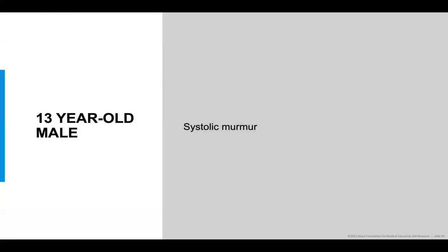Okay, this is a 13-year-old who went in for a yearly physical, and the pediatrician heard a systolic murmur and referred first to an echo, and then after the echo, they got a cardiac MR. And so this is an MR physics question. The question for all of you is, what are you seeing here in the bicuspid aortic valve?